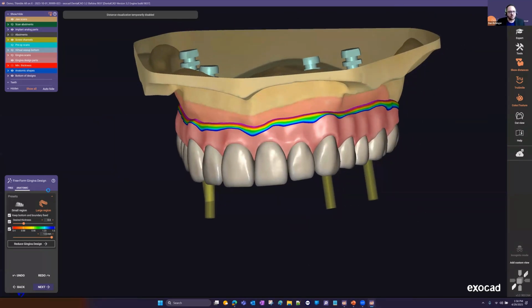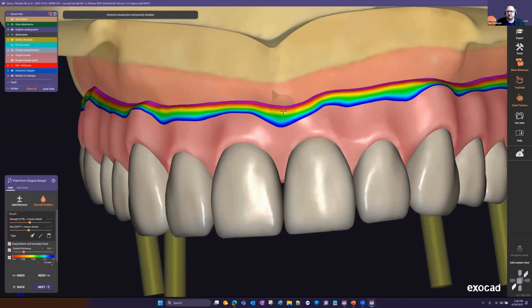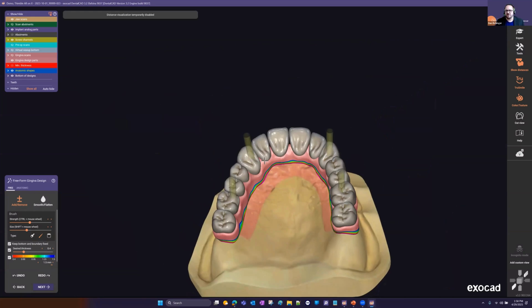Depending on how far you want to take that, if you're wanting to add in some anatomical features, as an example here, we can separate some things. But again, that's just a quick left click and drag. And we already went over that on the previous example.